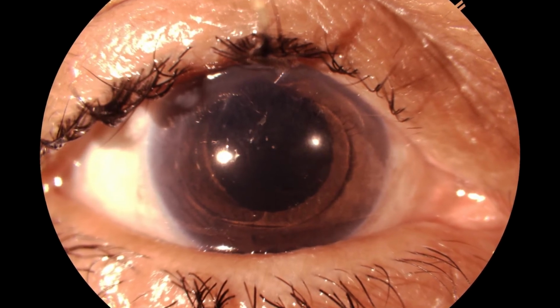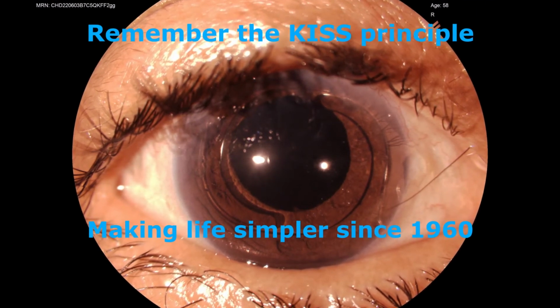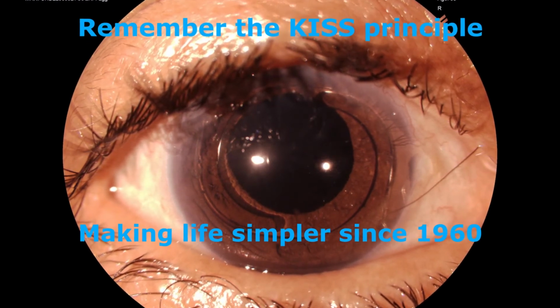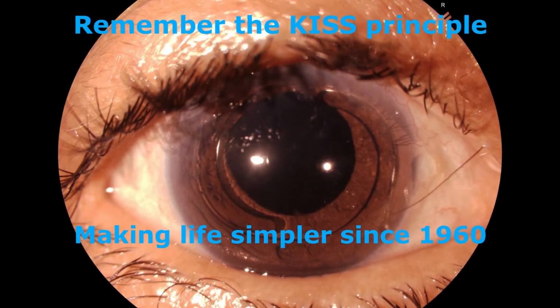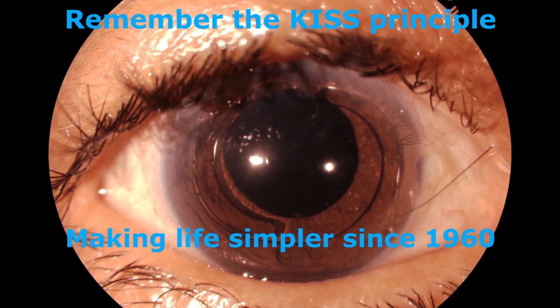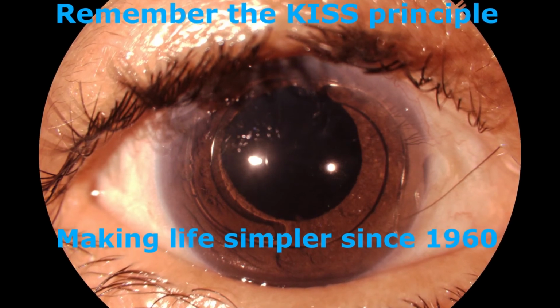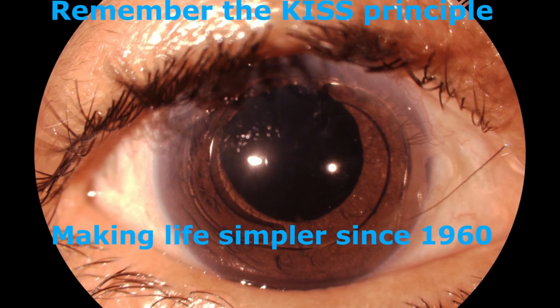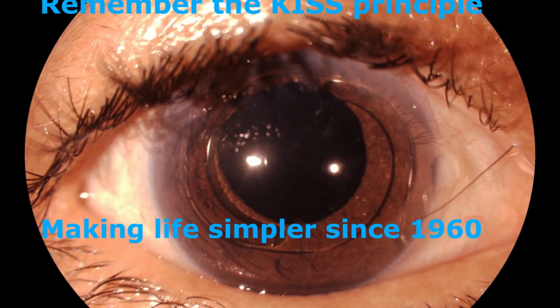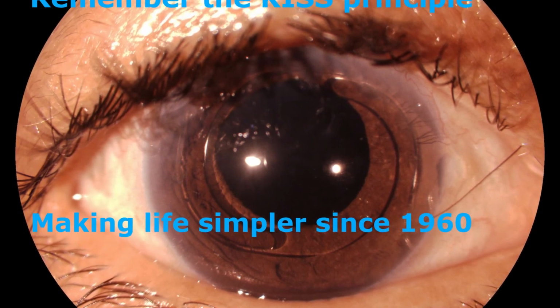This is the patient's anterior segment photographs as seen at day 1 and at day 30, and we can appreciate the corneal clarity and the IOL centration. In spite of all our efforts, this patient still had a persistent 3 diopters of corneal astigmatism. This eye was highly hypermetropic, so I had to look for an IOL of 30 diopters, which I couldn't get for an ACIOL, and we had to implant a 28 diopter IOL, which left behind a hypermetropia of 3 diopters. So the final refraction of this patient was 3 diopters of hypermetropia with 3 diopters of corneal astigmatism.